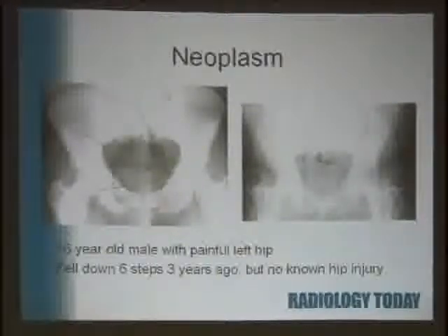Well, I think this is an aneurysmal bone cyst. And a lot of times, they start in something else. Fibrous dysplasia, subtle trauma. So you wonder, one of our MSK guys said he wants this as a teaching case because, as far as we can tell, there was nothing wrong 3 years ago. Now he's got this big lesion. So that would fit an aneurysmal bone cyst developing.